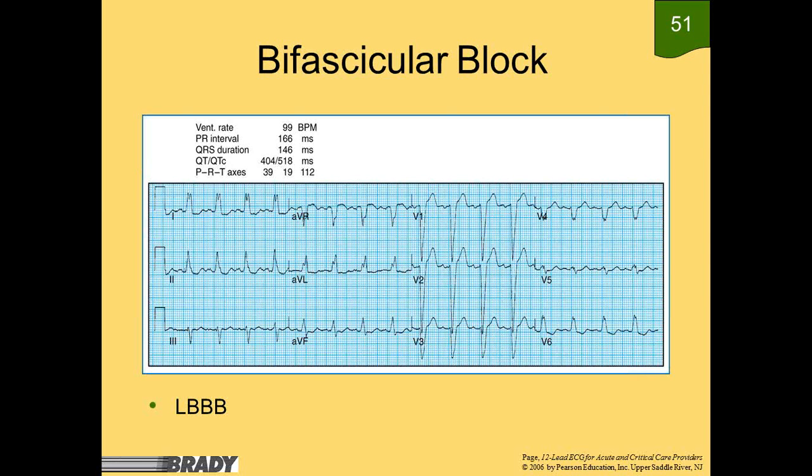looks like up, and down could be a physiologically left axis. Okay. And if we look, we've got an axis deviation of 19. That fits right in there. So that's a physiological left axis. It is not a block. Okay. But let's look over here.